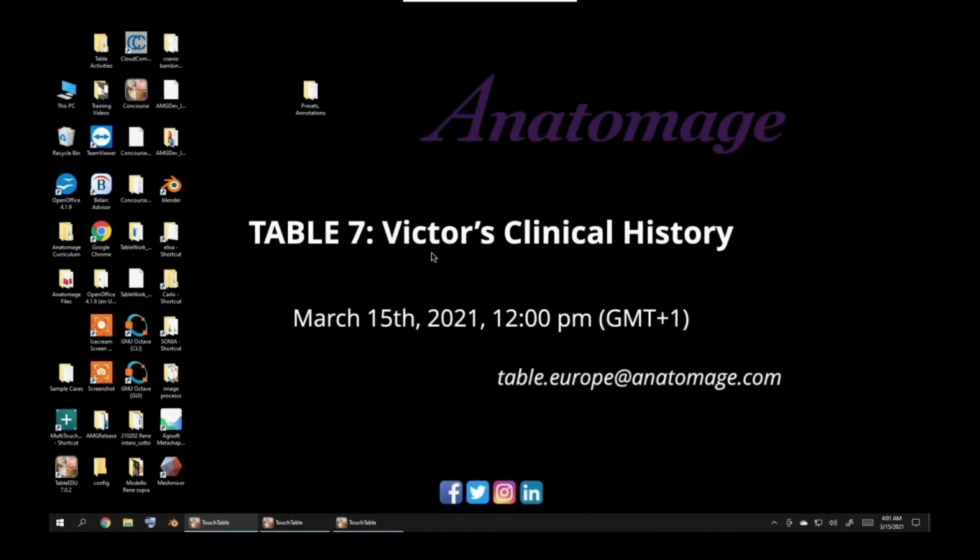So as you can see, this webinar will be focused on Victor's clinical history. Victor is one of the 4 cadavers present inside the anatomy table. What I will discuss with you today are all the diseases and the pathology that affected Victor and that can be seen, are visible, watching the data set of Victor from the anatomy table.